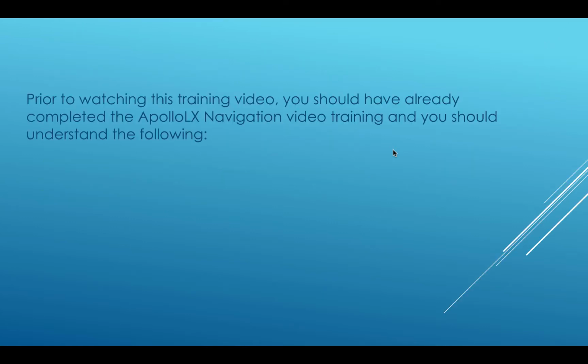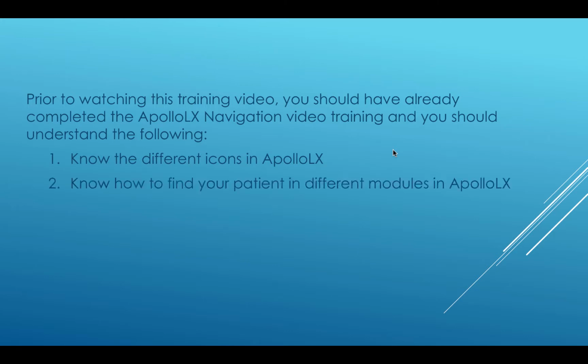Prior to watching this training video, you should have already completed the Apollo LX navigation video training, and you should understand the following. 1. Know the different icons in Apollo LX. 2. Know how to find your patient in different modules in Apollo LX. 3. Know how to navigate through a workflow to add or edit data.